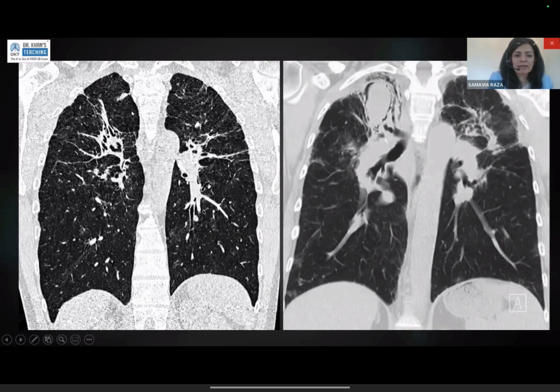What happens in that scenario is that it will ultimately turn into a cavity. You can have a cavity inside a dead part of the lung or a fibrosed part of the lung, and that cavity is essentially a breeding ground for opportunistic infection. So that's what happened in this CT, and that space has actually grown an aspergilloma. It's a very common complication in end-stage lung disease or fibrosis: when you have cavities, they do fill up with aspergilloma.